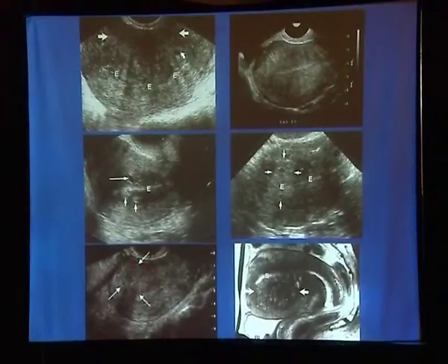You have a doubt whether it's a fibroid or an adenomyoma. Most often it will turn out to be a focal adenomyosis. And if you do an MRI on these patients, you'll get features like this. You have a nodular mass, multiple bright T2 hyperintense foci, and indistinct planes between this and the junctional zone. And if you see here, such a big nodule, there's no compression of the endometrium. So there's no mass effect as compared to a fibroid.